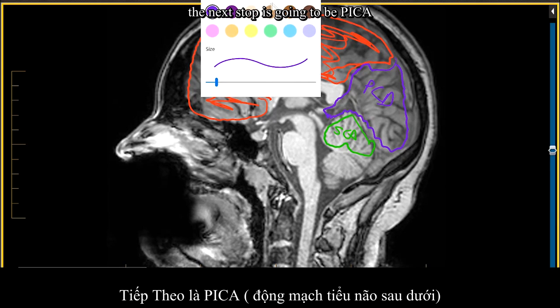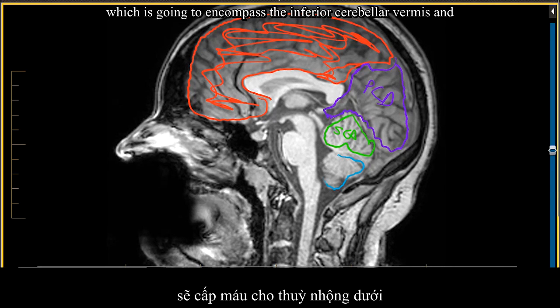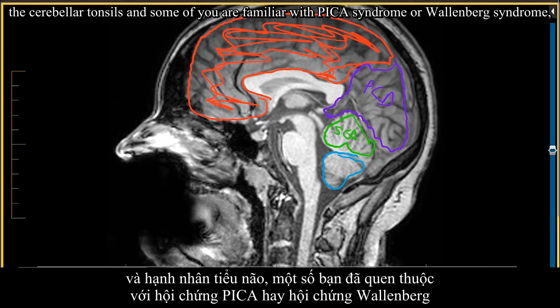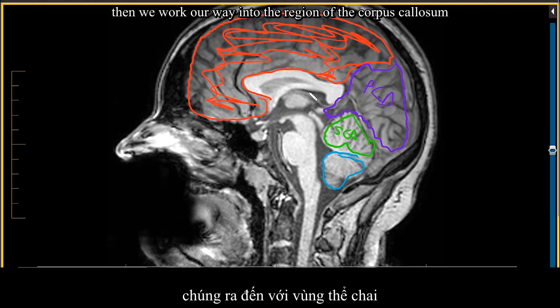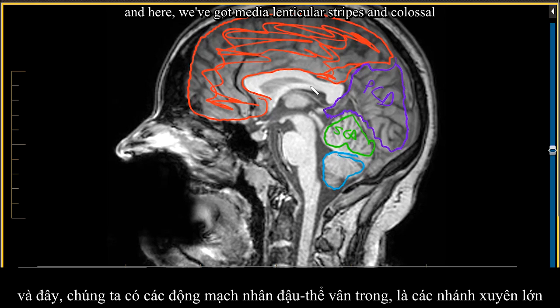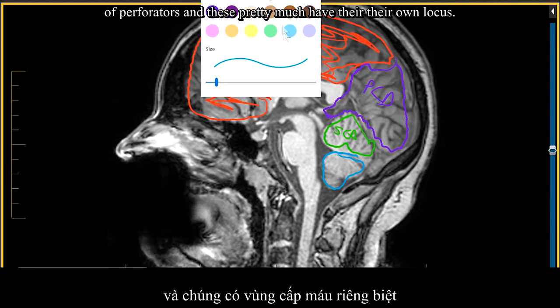The next stop is going to be PICA, which is going to encompass the inferior cerebellar vermis and the cerebellar tonsil. And some of you are familiar with PICA syndrome or Wallenberg syndrome, which is a pretty important one, especially for you medical students. Then we work our way into the region of the corpus callosum, and here we've got medial lenticulostriates and callosal perforators, and these pretty much have their own locus.